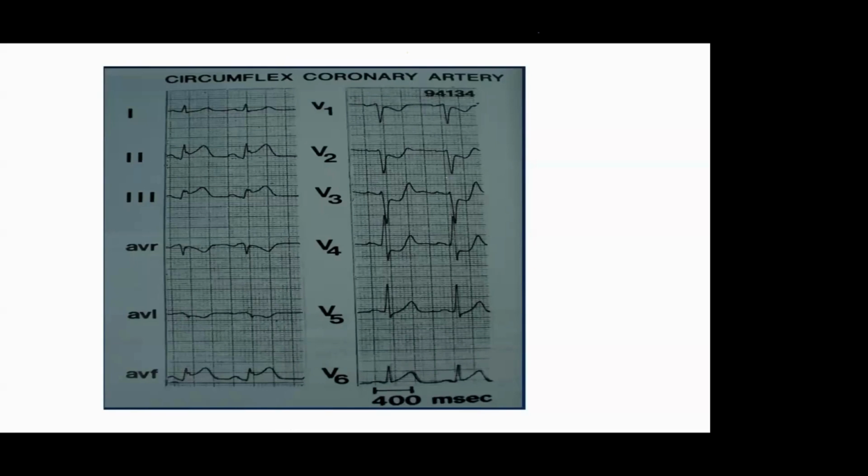Then you have to see the other leads, posterior wall changes, because this is going posterior of the heart. So V2, V3 is having ST depression. aVL also will have some changes. V5, V6 also some changes. So in this, if you see the profound LV changes, then it will be like ST depression in V2, V3, posterior wall changes, inferior changes, lateral changes, then usually circumflex artery.